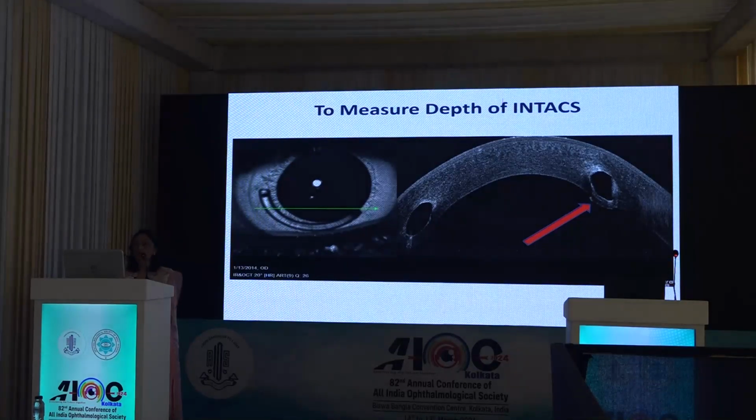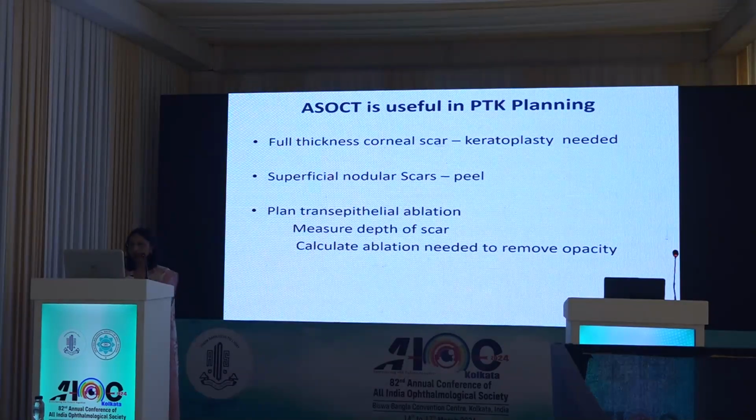Ultra high resolution OCT can even visualize the intracorneal ring segments very clearly. And you can see if there is any stromal thinning, overlying stromal melt, or early extrusion of the intacs. All these things help us clinically to manage the patients.